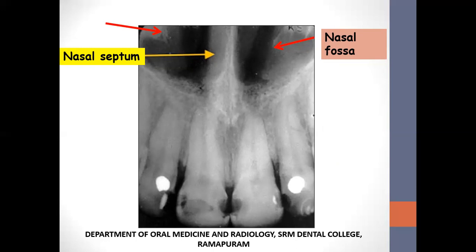On the periapical radiographs of the incisors, the inferior border of the fossa appears as a radiopaque line extending bilaterally away from the base of the anterior nasal spine. Above this line is the radiolucent space of the inferior portion of the cavity. If the radiograph was made with the X-ray beam directed in the sagittal plane, the relatively radiopaque nasal septum is seen arising in the midline from the anterior nasal spine. The nasal cavity contains the opaque shadows of the inferior concha, extending from the right and left lateral walls varying distances towards the septum.